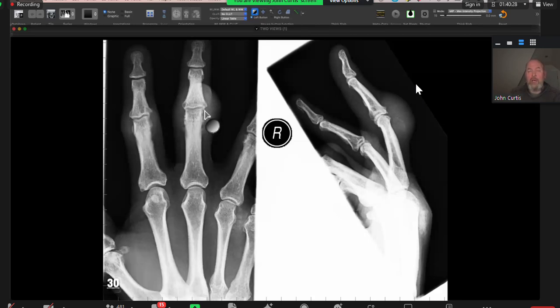Okay, and what do you call the position of that erosion? Juxta-articular. And what about the density of the soft tissue swelling? Most likely a calcific density, because I can see some high density areas within it. So what's the most likely diagnosis? Gout. Yeah, tophaceous gout. Well done.